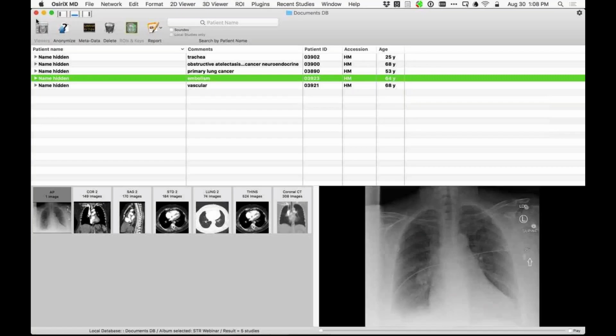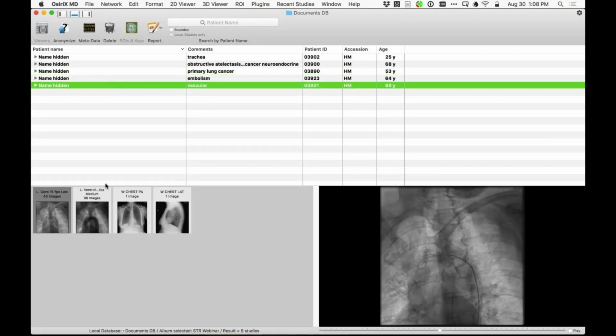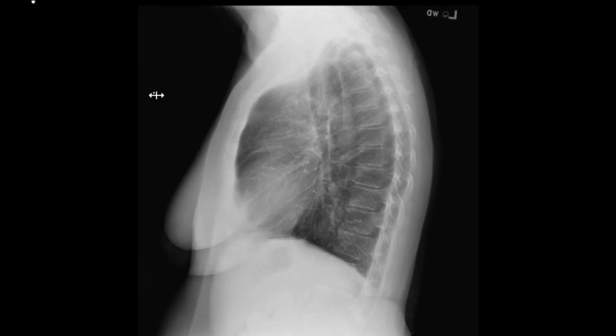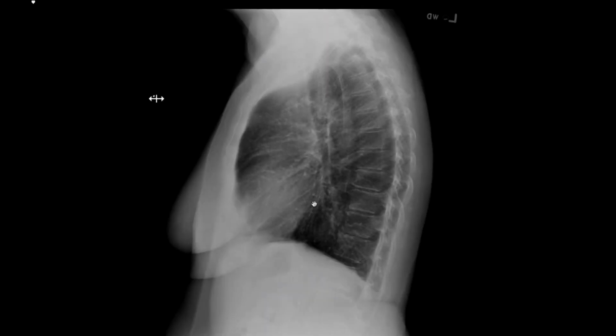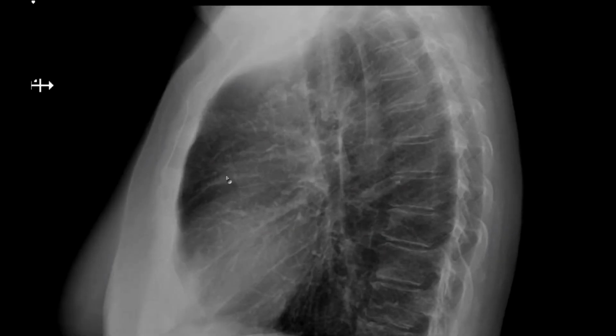All right, let me show you another one. This is really just kind of a fun case for anatomy. So I'll show you this image. There's no particular diagnosis to make on the radiographs, but I want to bring up the lateral by itself just for a moment. And then I'll show you a follow-up exam.